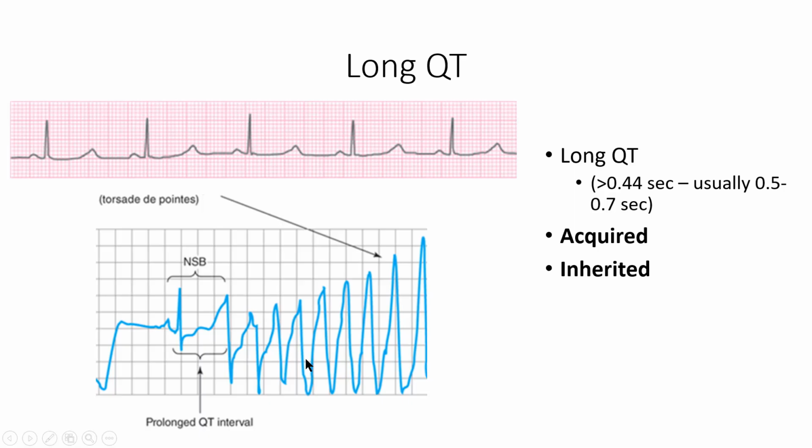For the most part, EKG computers do a pretty good job in measuring and correcting the QT interval if there is no arrhythmia or AV block associated. Nevertheless, I like to do a quick eyeball check on all of my EKGs. What I'll do is find two R waves and then draw a line between those. Then I'll draw a line perpendicular to the initial line in a way that completely bisects it in two equal halves. If that line comes down and punctures any part of the T wave, then we will conclude that the QT interval is indeed prolonged. And the good thing about the eyeball method is that it does adjust for the R to R variability.